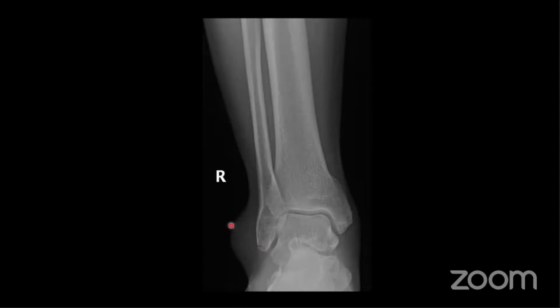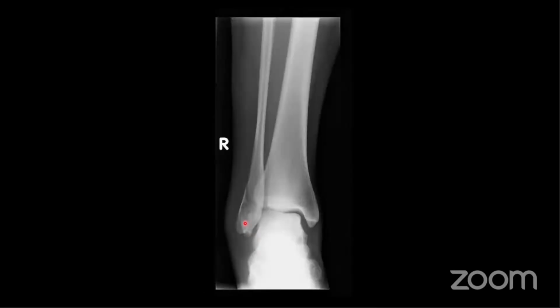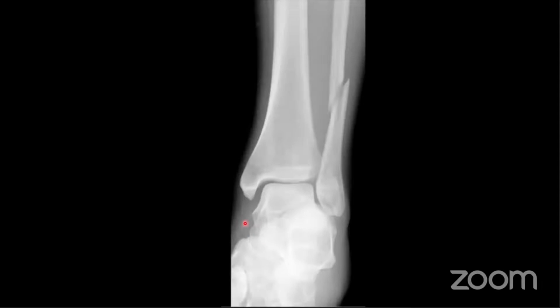So even if this was more subtle, this will draw your attention to it. What about this one? Yep, very good. And finally, probably no points for this either. Yep, great.